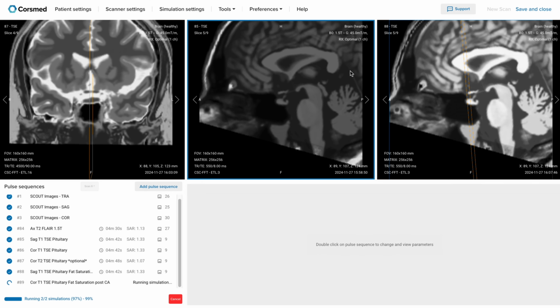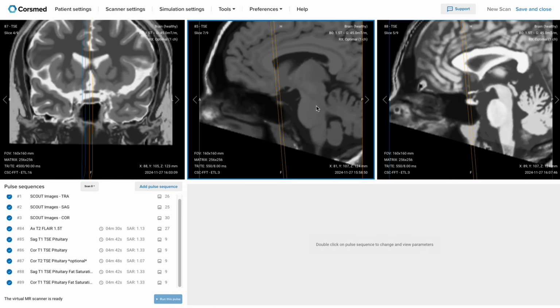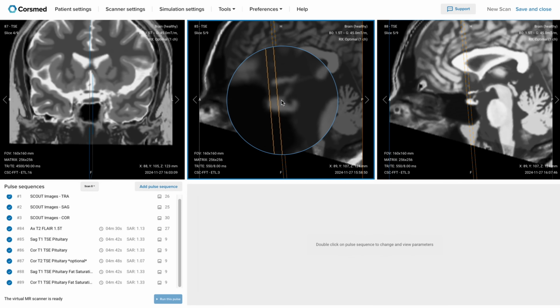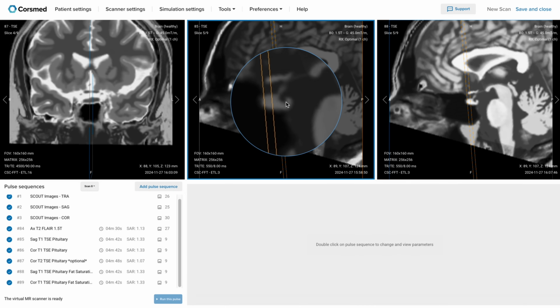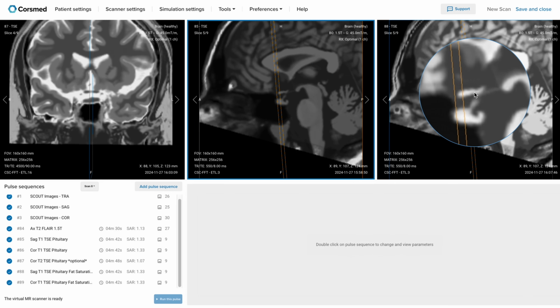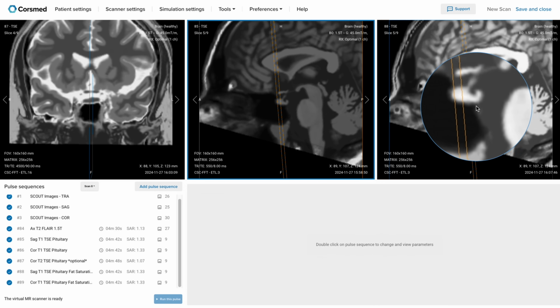Here, we already have the sagittal images, and I'll bring up the coronal images here as well. You can see that these post-contrast images are very bright. First, let's review the sagittal images. On the left side, you can see the non-contrast acquisition. Here we can clearly observe the optic chiasm, the infundibulum, the corpus or body of the pituitary gland, and the back of the sella. The post-contrast sagittal images display these structures very clearly, appearing bright and hyperintense.